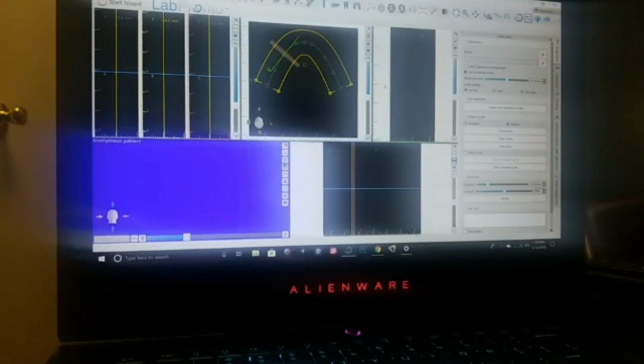Now, we're going to use a Blue Sky Bio simulated program, where anybody can download this program at no cost. So if you don't have it on your computer, just go into blueskybio.com and download their program onto your computer. It's okay for now, you don't need to do that right now. You could watch me as we go along, but for the future, it's not a bad idea to go ahead and do that.